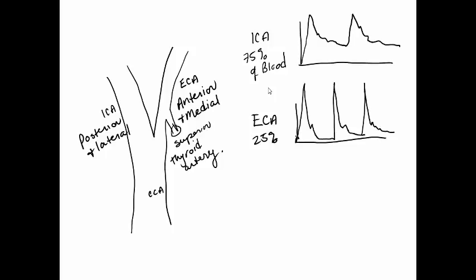And because our face doesn't need blood supply at all parts of the cardiac cycle and has higher resistance, or the blood has a tougher time getting there, it has a sharp systolic peak, and it has quite a brisk acceleration. It comes back down to the baseline and then has very minimal end diastolic flow. It has high pulsatility again, so a large difference between peak systolic and end diastolic velocities.